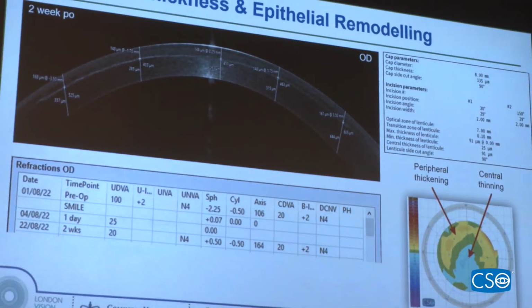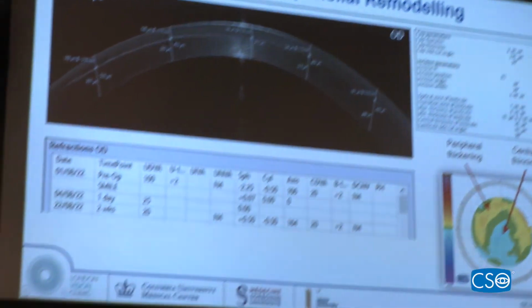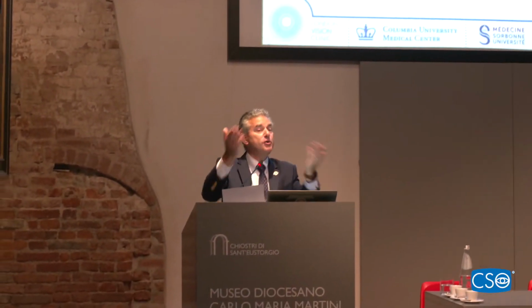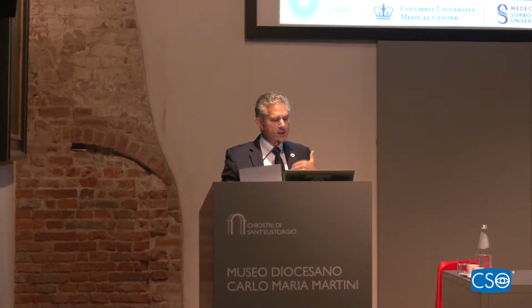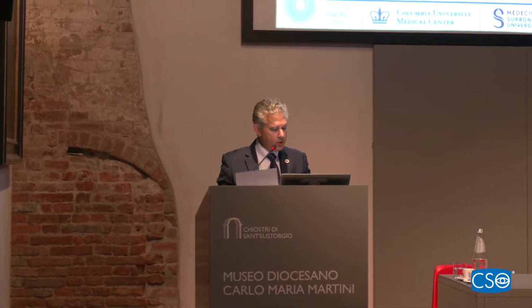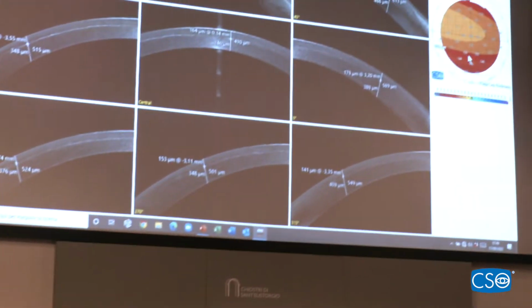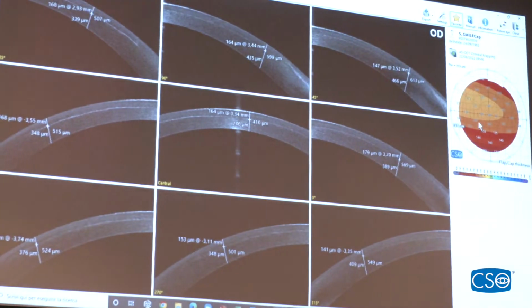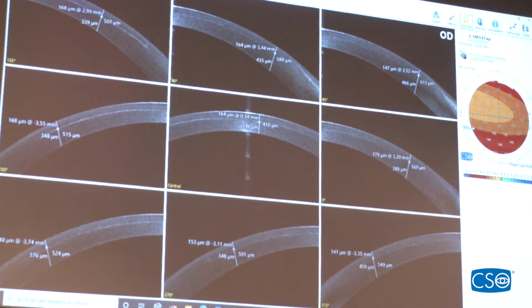You can only know what happened at the time if you get the stromal component of the flap post-op and add the pre-op epithelium to it. Then you know what the flap or cap was. This is the way that we program flaps over caps. We need to know the minimum or maximum thickness, so that we can make sure we program a flap on top that is not going to cross into the interface.